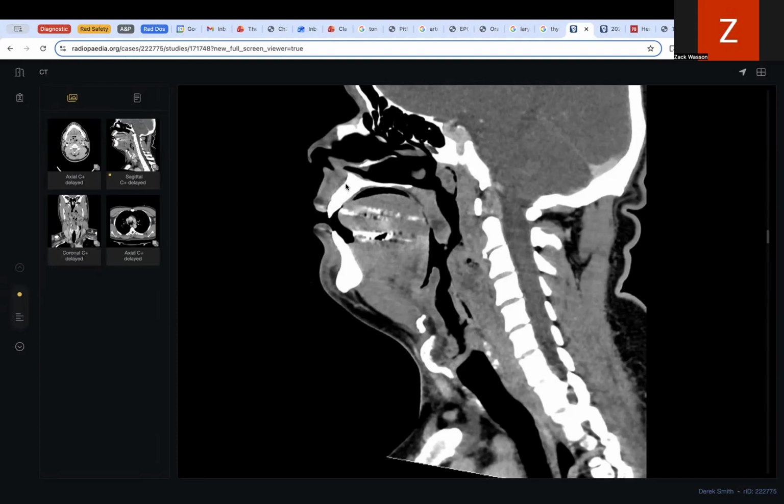before it goes into your respiratory system. So here's a good view coming down from the nasal septum, the nasal area, right into your oral cavity. You can see the hard palate here. That's bone. You can see it because of the attenuation of the photons. Obviously, there's high attenuating bone in a CT image, and then the soft palate here on the back. You can see the tongue, obviously, the base of the tongue, genioglossus muscles here, maxilla, mandible.